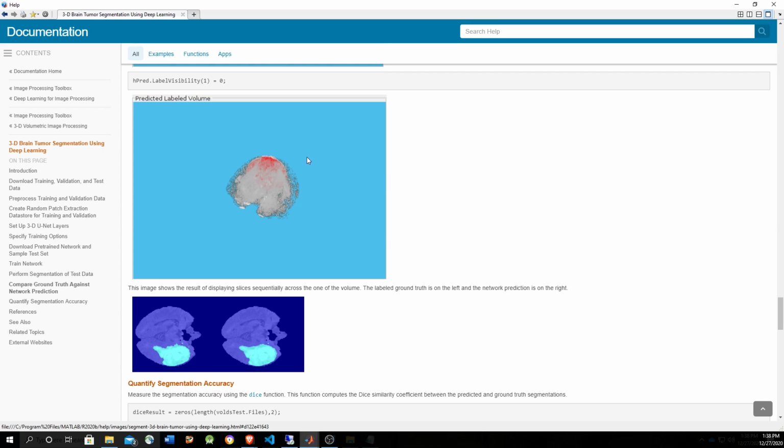And also for the input, for training the neural network, we're going to provide labels for the corresponding image. And the labels are volumes of the same size as the image, but instead of having colors, it's going to have the label indicating whether the element has a tumor or not.